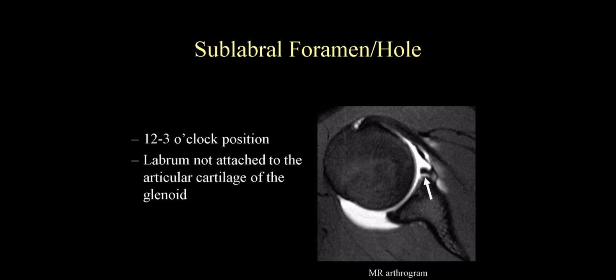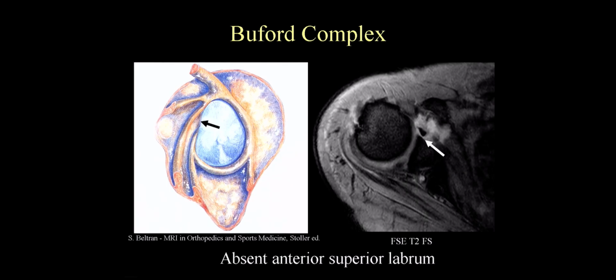If you look on your axial image, if you look at the cross-hatching with your sagittal view, make sure you're in that anterior superior quadrant, because sometimes it's a little bit confusing when you're crossing that midline portion. But this is superior to the midline, and this is the foramen.